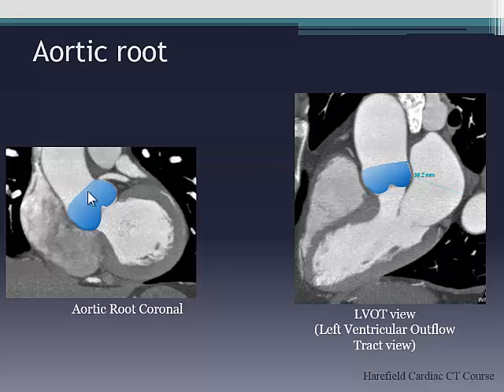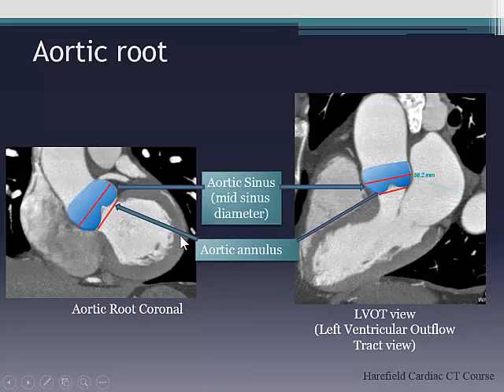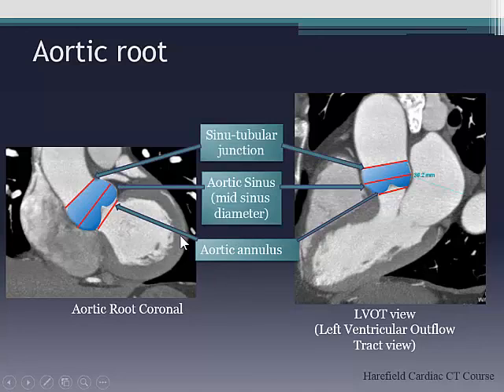Obviously, all the outcome data is based on echo, so you could say, well, does it matter? It can matter because if you've got a very big elliptical measurement, so coronal measurement, then it's going to be more robust to follow that up using a different modality to echo because you just can't get that plane. Okay, so again, emphasizing that.